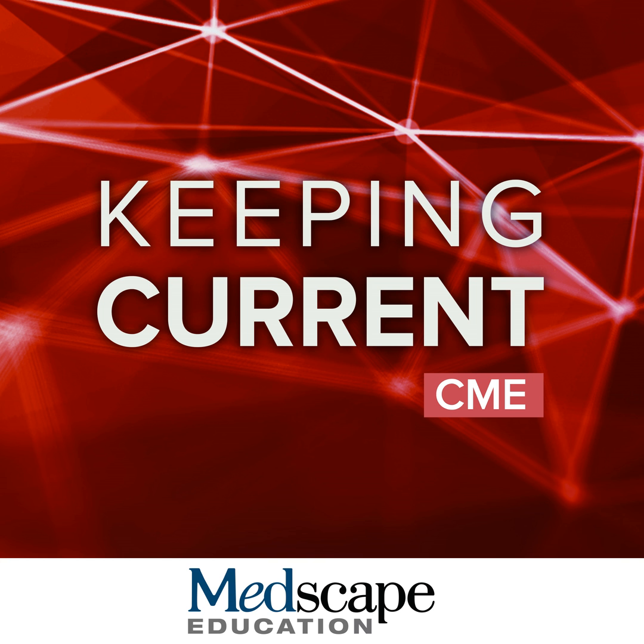Here's an example of a clinical case. This is a stress perfusion cardiac MRI patient who came in with a bypass 8 years earlier, coming in with new onset chest pain with an elevated troponin. This showed a defect in the anterior wall of the heart.